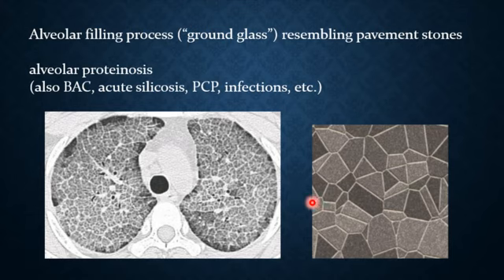So what do we mean by crazy paving pattern? It has two signs radiologically: ground glass and interlobular septal thickening. Exactly. It has to be together to produce this appearance. The lines are the interlobular septal thickening, while the increased density of the lung is the ground glass appearance. Okay, it's the airspace opacification.